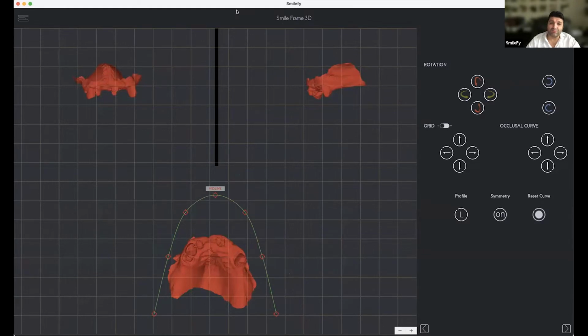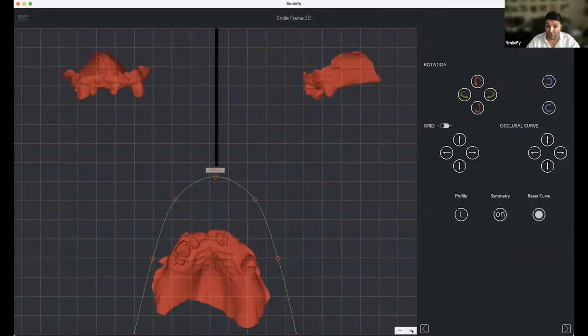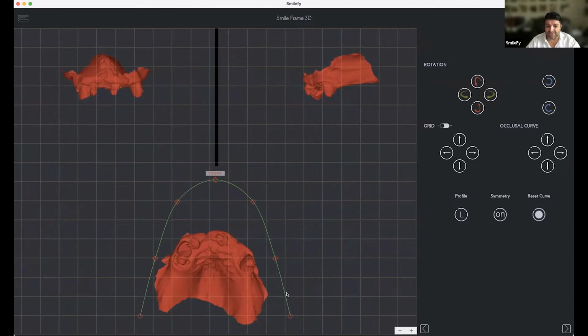Akil, the problem with the calibration is that the points you set on the picture and on the intraoral scan need to be very, very precise. Even a 1 degree or 1 millimeter shift, because the calculation is so precise, is going to calculate a completely different angulation.